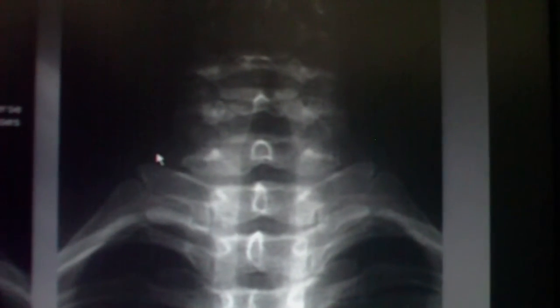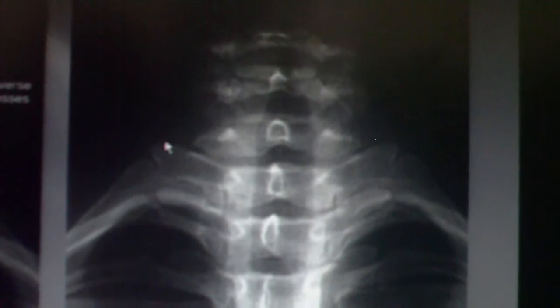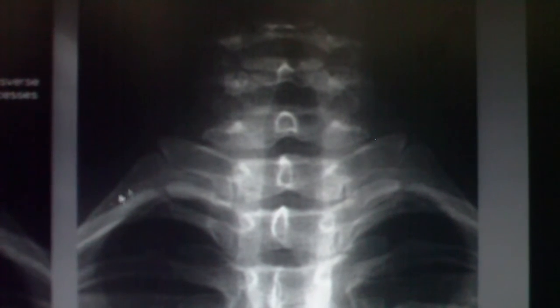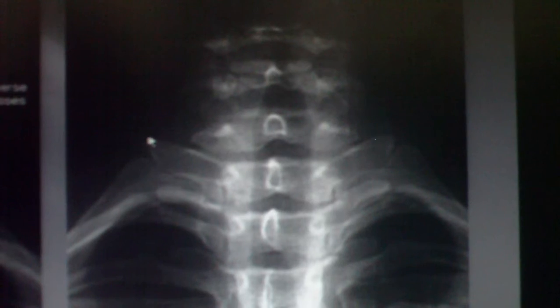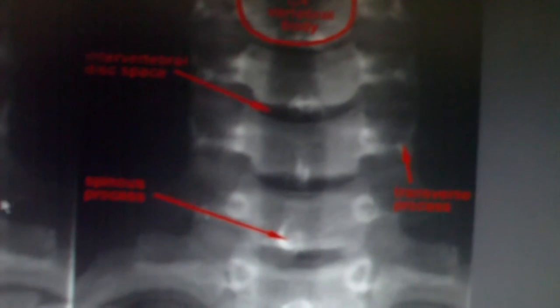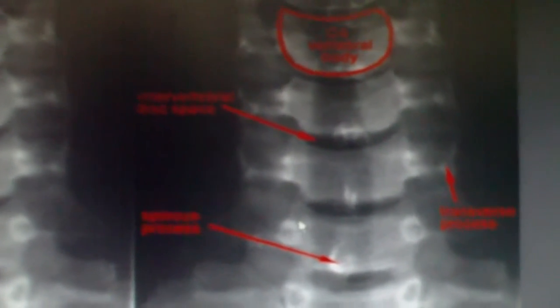The transverse processes of C7 shouldn't point beyond the transverses of T1, and usually at C7 they point horizontally or down, versus the transverses of T1, which point up and back, and usually have a rib articulated with them. Not unusual to see an unfused apophysis on the transverse processes of T1. That happens quite readily. Okay, so all this stuff you should probably know.